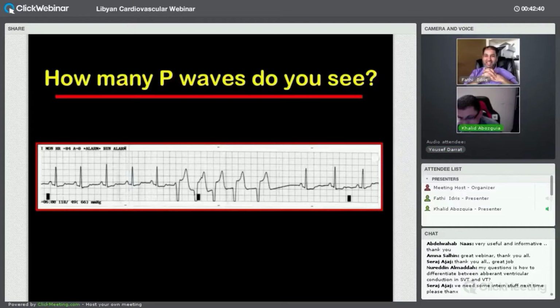We disagree. We agree to disagree on this one. Right. Because, okay, V1, here is my explanation: the inferior leads could tell you whether the activation goes high to low or low to high, whereas V1 cannot.